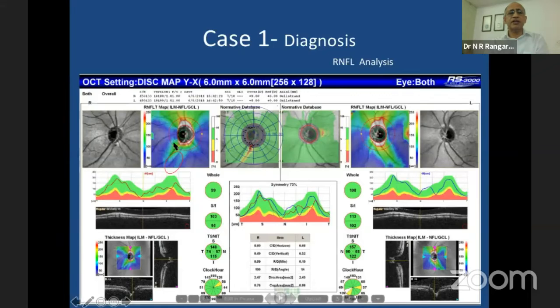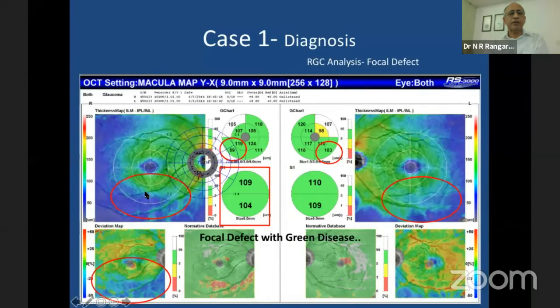It just measures a fixed diameter, and that fixed diameter does not coincide, and actually it is green. So I basically have a green disease. When we look at glaucoma, it's the inner retinal layers which are affected, so the Wallerian degeneration has not yet reached the optic nerves. But when you look at the macular map, you can see that definitely there is a loss.